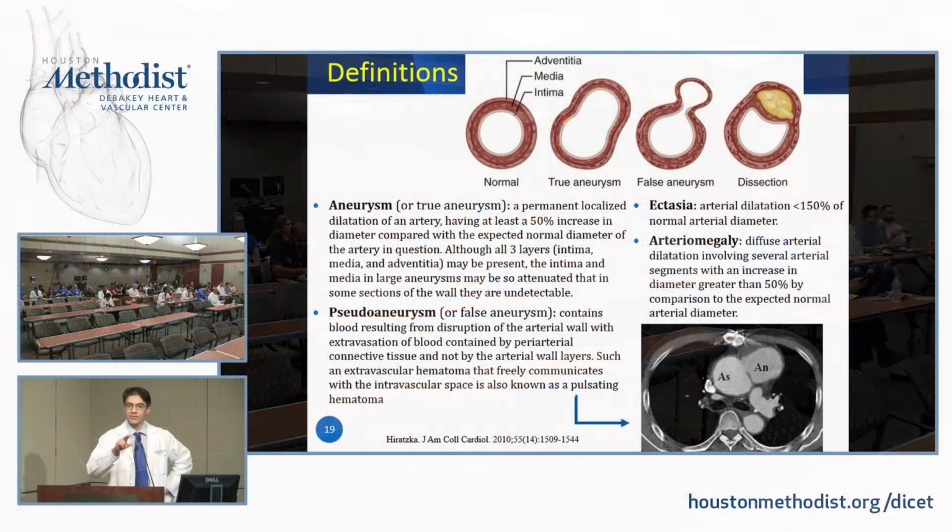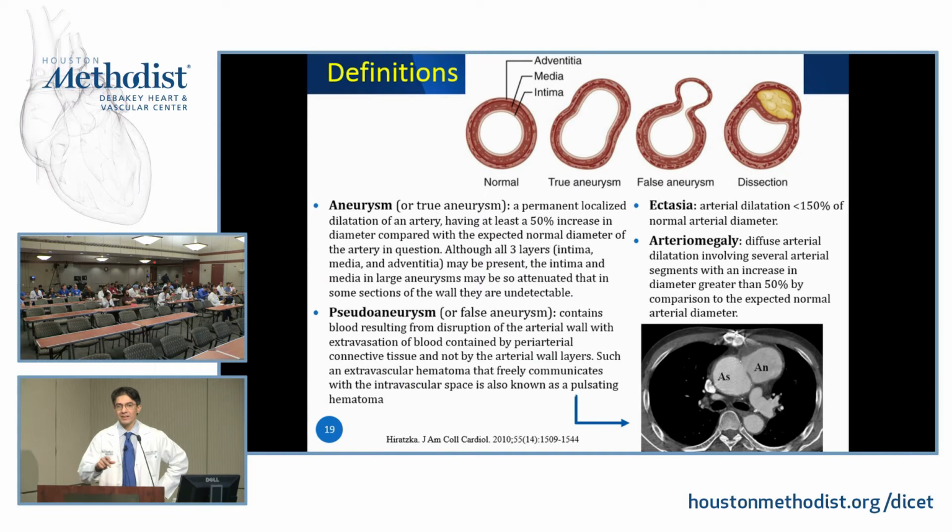All the surgical treatment starts when it's that big. So maybe it's not unreasonable. It is definitely enlarged, but the definition of aneurysm is 50% greater than the mean. And that's the difficult part, defining what the normal mean is for this patient. Maybe it brings up the question of whether we need to revisit this definition of aneurysm.